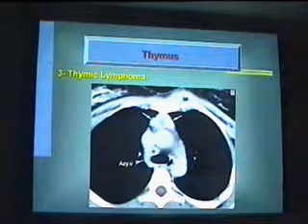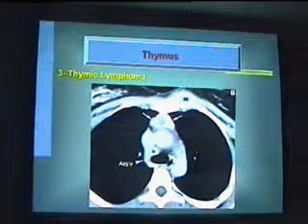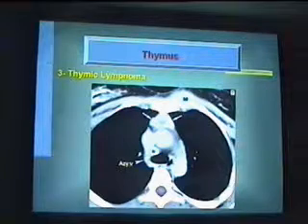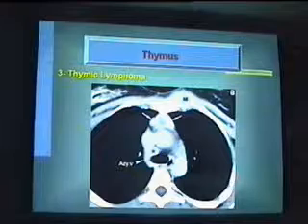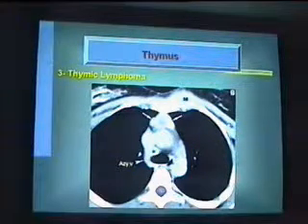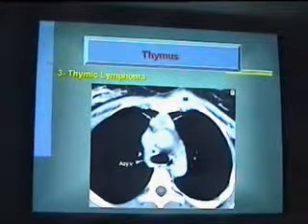بصوا منظرها يا جماعة لسه عندها برضو الشكل بتاعها ده. أوكي؟ حد هيقول لي دي ليه مش ليمف نودز؟ الحقيقة ممكن جدا نقول إن دي بري فاسكولار ليمف نودز. لكن في وجود إن العيان ده صغير في السن ولسه في thymic tissue فوي كان say that this is a thymic infiltration by lymphoma.